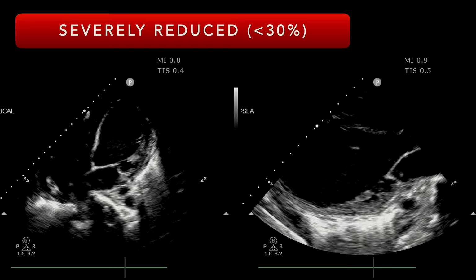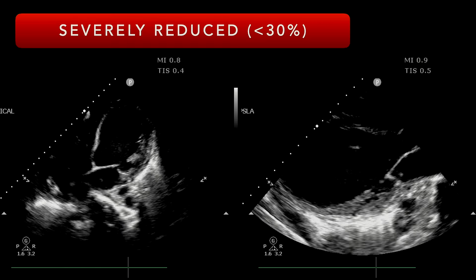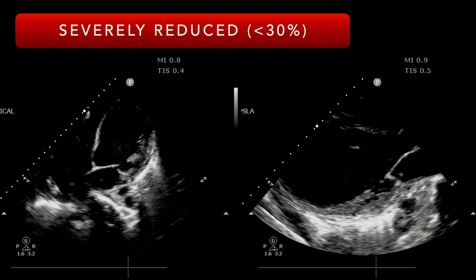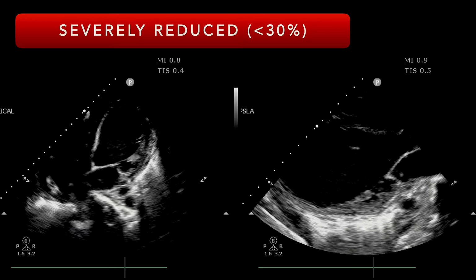And so we see, again, applying those same principles, do we see the endocardial border? Yes, we see that. Is there thickening of the wall circumferentially? Well, as we look at this one, there's very little appreciable thickening of this wall, right? Which translates into the fact that there's very little actual wall excursion happening here. The chamber size between systole and diastole is not appreciably different.